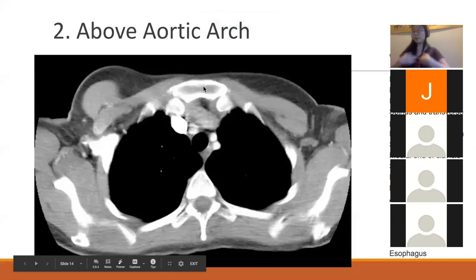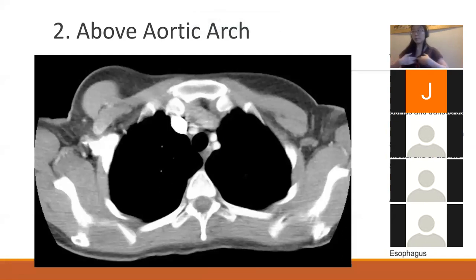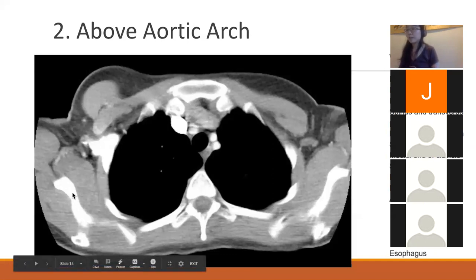This is going to be the very front of your chest, and that's going to be the manubrium of your sternum, right? Your sternum's right here. And then what do you think these are going to be? These are going to be your clavicles, because your clavicles, remember, articulate with the very top of your sternum. So these right here aren't vessels, these are bones. You have some ribs coming off here, and then you have the scapula.